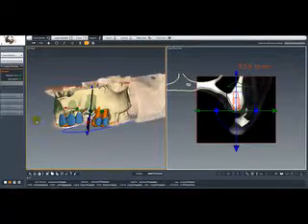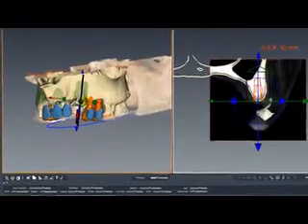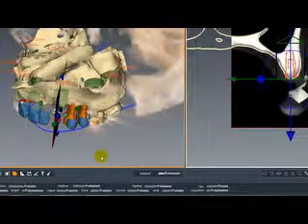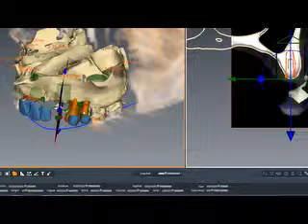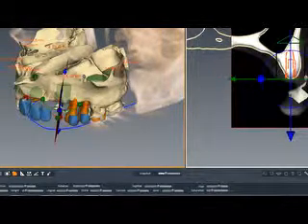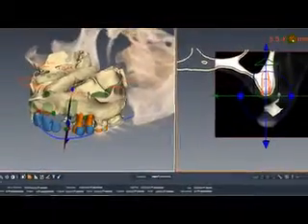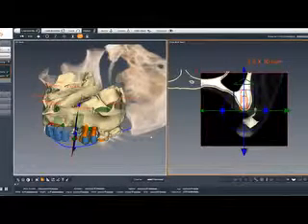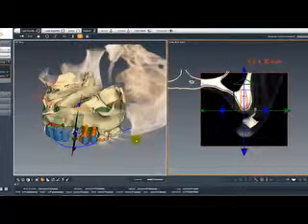So here it is, the tooth number 11 implant. I'm placing it right here, again anterior to the sinuses that are present, so in this area we will pretty much be in good bone. As you can see in the 2D view, I'm proposing a 3.5 by 10 millimeter implant as well. We could augment a little bit more on the buccal lingual area and secure the bone around this implant, because this is the transition for the cross-arch stabilization of the implants proposed.